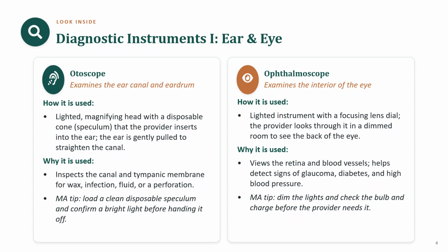Your job is to dim the lights and make sure the instrument is charged. Notice the pattern we will repeat for every instrument. We'll go over what it does, why it matters, and what you do to get it ready.